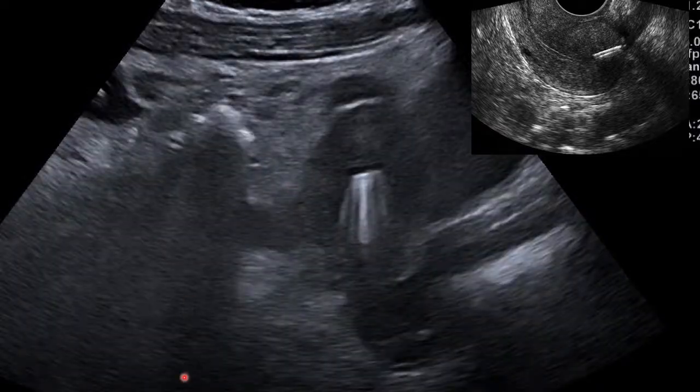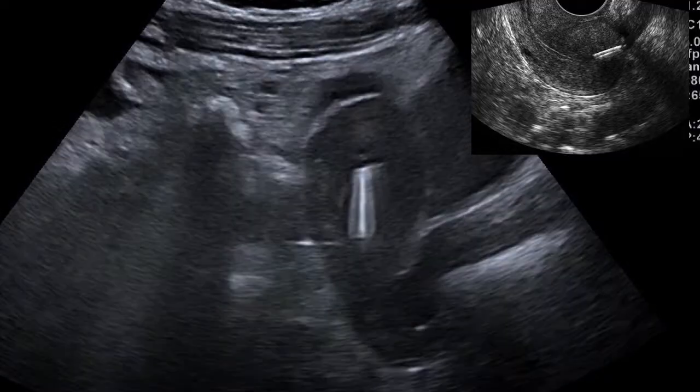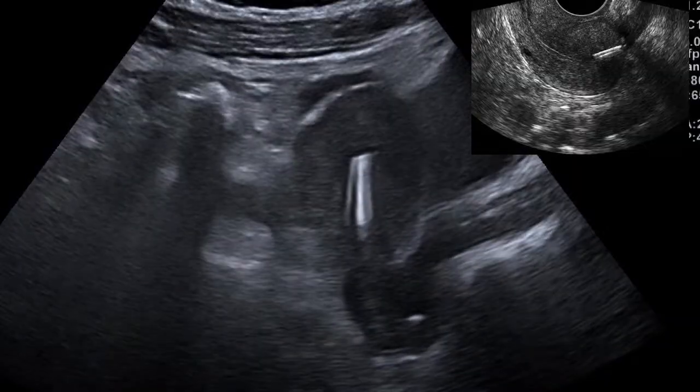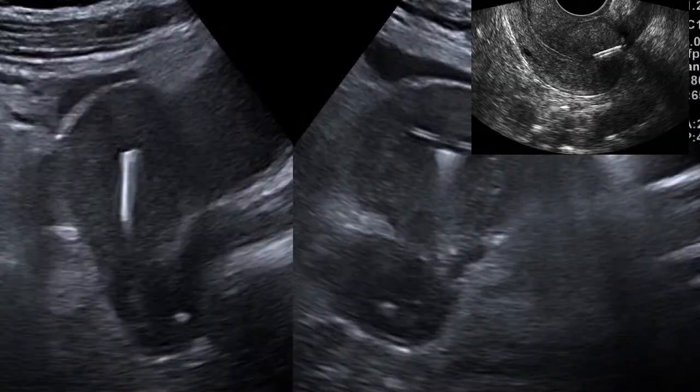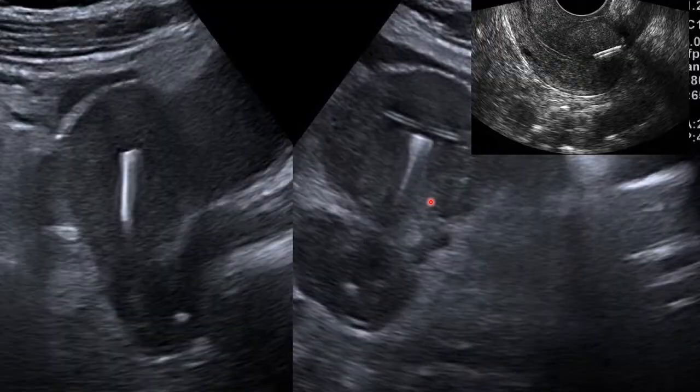So in this case, or in my case, there was no evidence of an IUCD causing the symptoms whatsoever, unless maybe you saw something otherwise, but I tried my best and I couldn't. So now, what could be the differentials in case the IUCD is in position, like in my case?